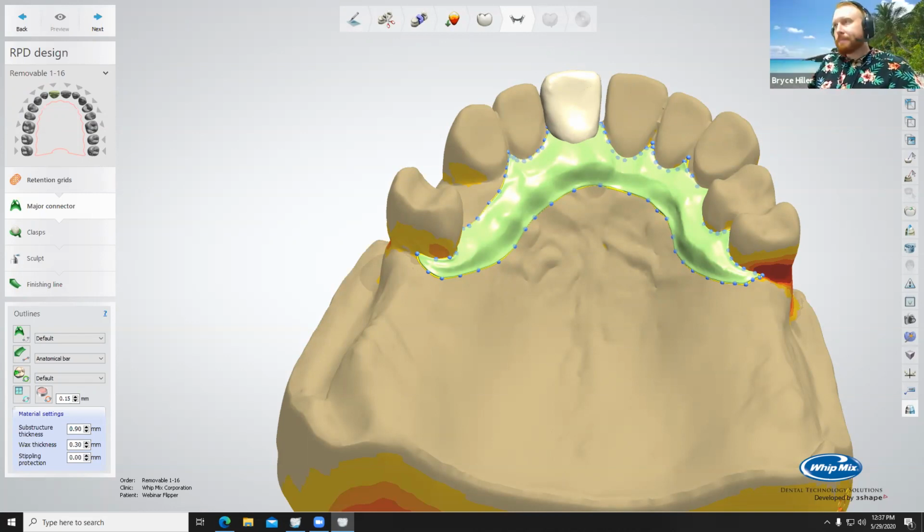Before you actually go through the scanning process, or you could technically carve it in when we virtually remove the tooth itself. I don't think this cast actually has a bead line on it in any way, shape, or form. It's just like a post palatal seal on a denture. I prefer to have it on the actual stone cast personally. I don't know why, it just makes me feel better, I guess. So I would probably carve it in on the actual cast.